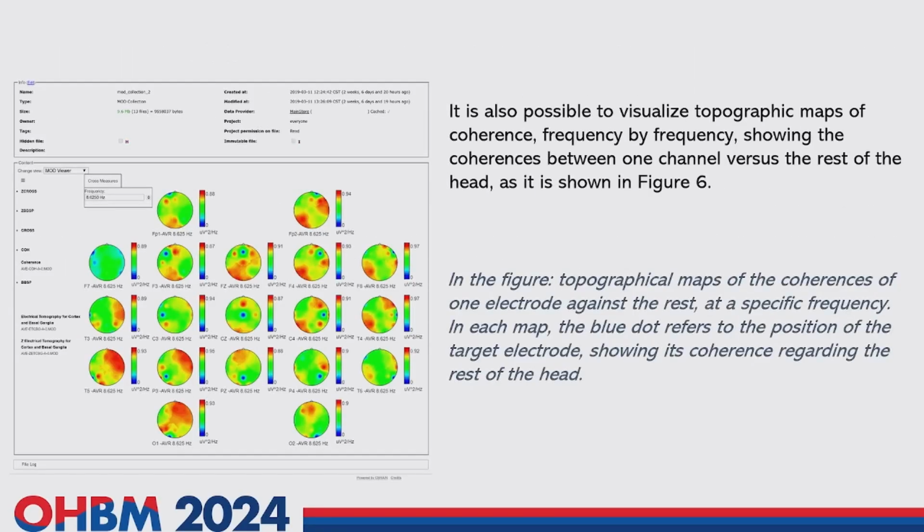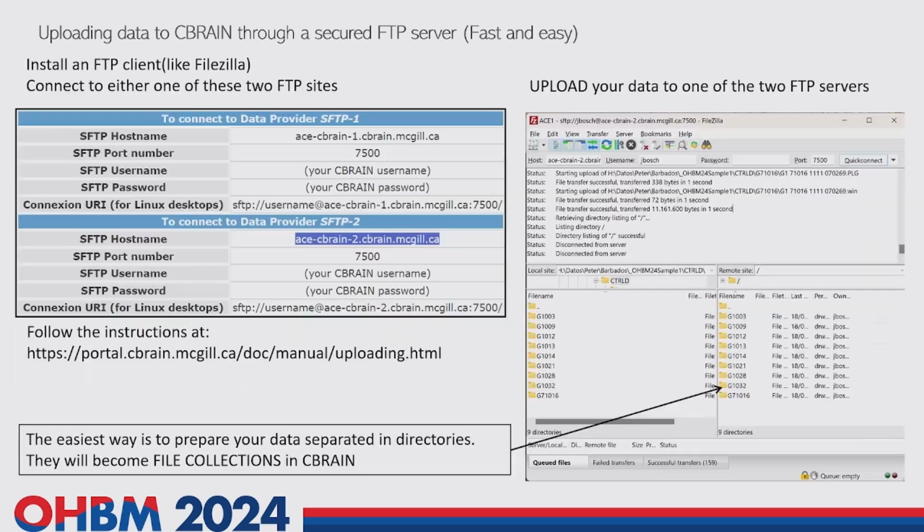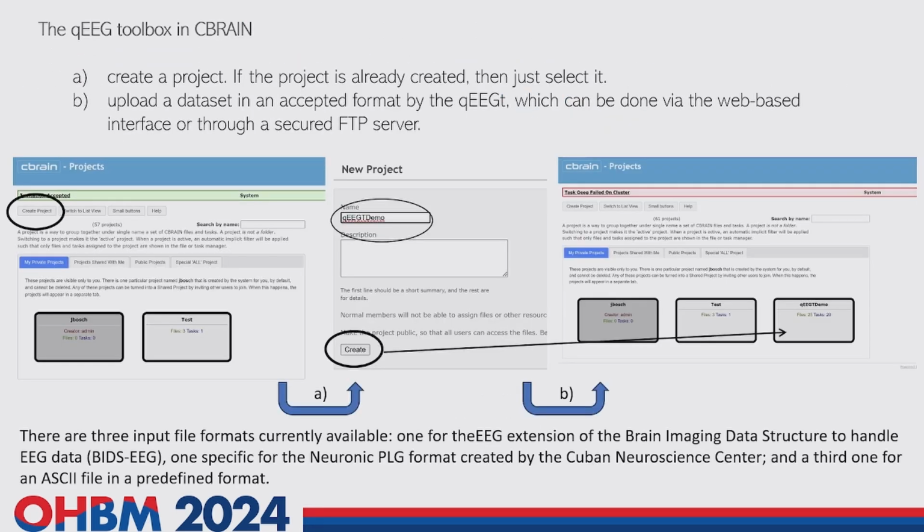Go to the beginning. I just try to make this very didactic, step by step, so you have the presentation, and anytime you want to do it, you can do it later also. Okay, then you create your project, and the project appears there.